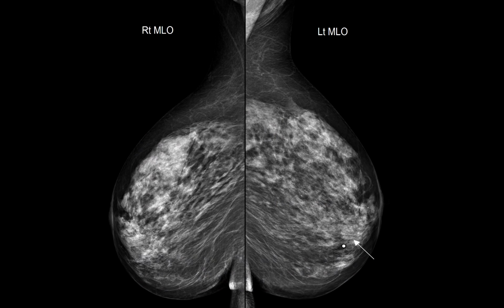We mark the area where the referring physician and the patient thought that there would be a palpable lesion, but on the medial lateral and on the CC projections, we couldn't see any tumor mass, any malignant type calcifications. I'd like to make a note. We could not position the patient better. She was in bad general condition and she was after stroke. But the impression is interesting here.